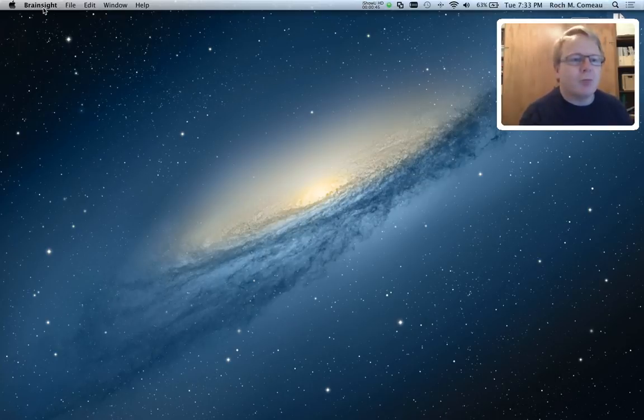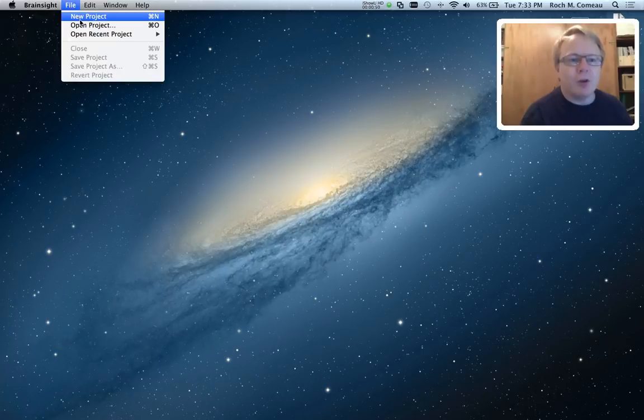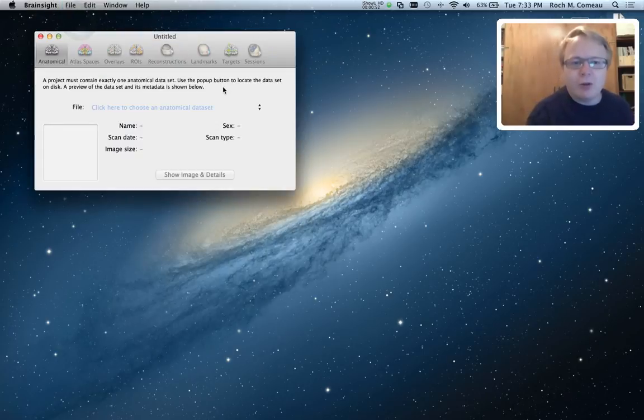So we've already launched Brainsight, and if I click into the File menu and say New Project, here is the area that we call the project window. I'll try to keep this demo down to about 10 minutes. So this project window is where you focus most of your attention. In fact, all the steps that you want to perform before your TMS session are laid out as little icons along the top of this window.